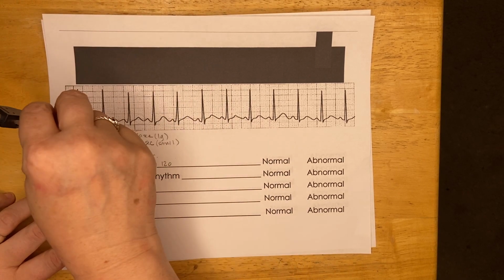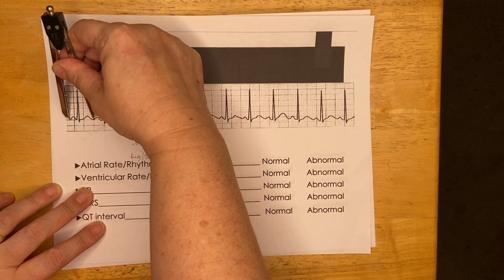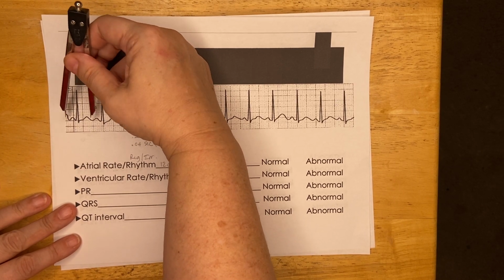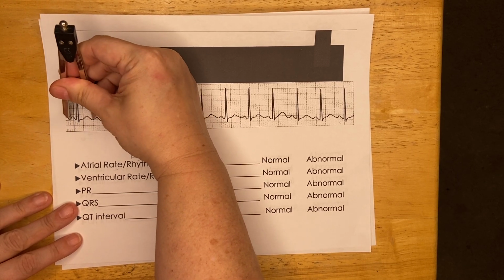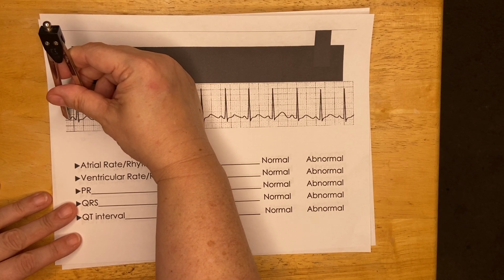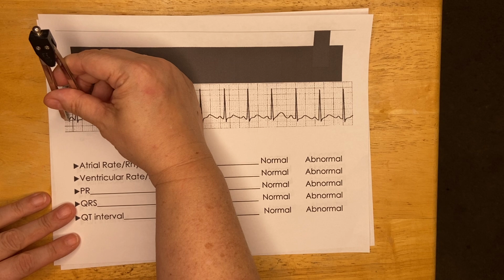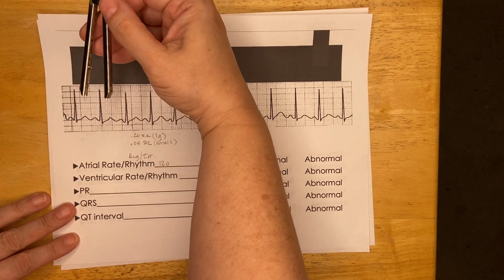I'm going to plant my calipers at the beginning of the P wave and go to the beginning of the next P wave. You don't want to count P waves from the tallest peak. You want to count from the beginning of one impulse to the beginning of the next impulse on the isoelectric line. I think that's a big mistake that people probably made on the initial assignment, and that's okay. You are here to learn from mistakes, and I, on purpose, didn't give you much teaching ahead of time, just to see where we were at.